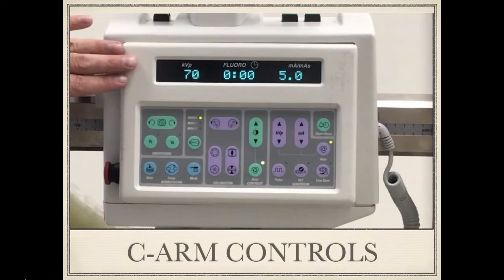You've got two types of collimators. One is the iris collimator, which is the buttons over here. These close in circularly onto the center of the image. The other one is the shutter collimator, or the leaf collimator, which are these two buttons. This is like shutters coming in from both sides and narrowing down the area of vision. With the shutter collimators, you can rotate them using these two buttons to get the orientation you want to confine to the anatomy. These are quite useful to increase the image quality and to reduce the radiation exposure.